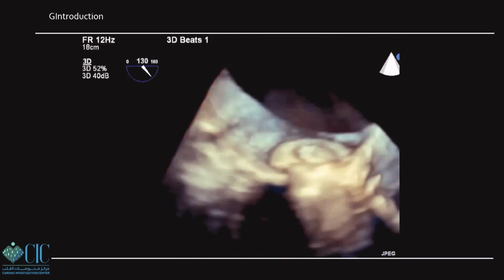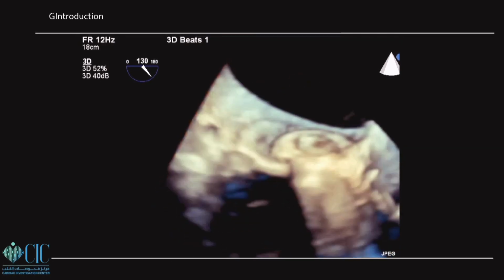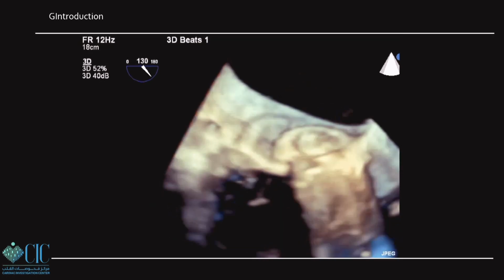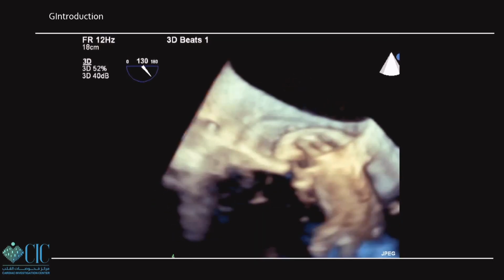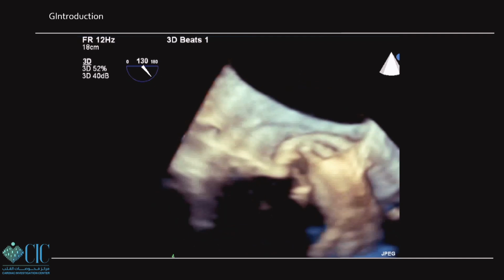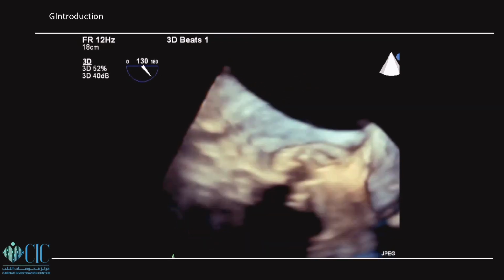So the defect is like taking a sliding track from the left atrium to the left ventricle. This is very dangerous in terms of percutaneous closure. If you see this, think twice before sending the patient to the cath lab, because the previous one, the straight one, if they insert the catheter from the LA through transseptal puncture or from the LV, it will go straight away to the other side without touching the discs of the valve. But this one, if they try to insert a catheter from here, it will take this sliding track and touch what?